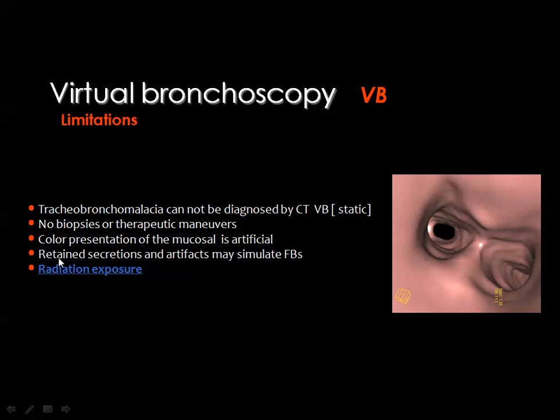Retained secretions, and this is very important. Retained secretions may simulate foreign bodies like mucus plugs, and the secretions will appear as similar as the foreign bodies. And what's very important in the pediatric age group is the radiation exposure, which we should take care about this hazard.